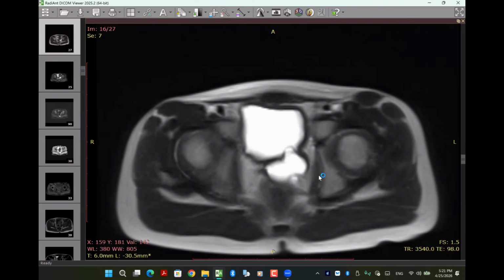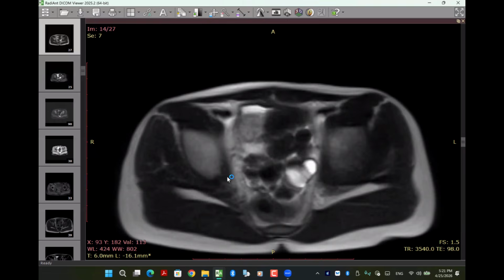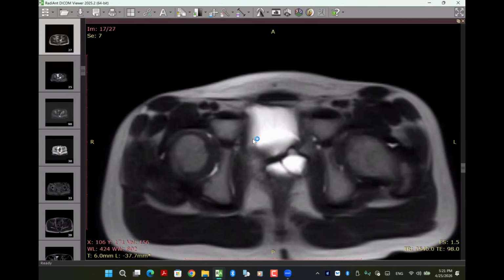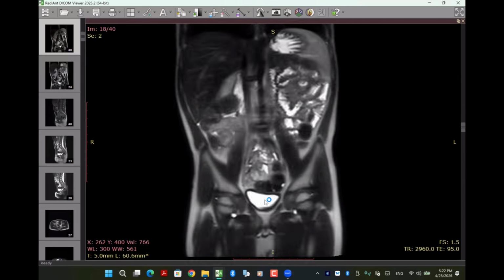It can be a urinary bladder diverticulum, or it can be a ureterocele. However, ureteroceles are usually within the bladder. It can also be a seminal vesicle cyst. Excellent differential diagnosis. Continue. What should you also review for this case? What will you search for in this case? I would like to see the ureters and the kidney. Nice. Okay, this is the coronal for this case.